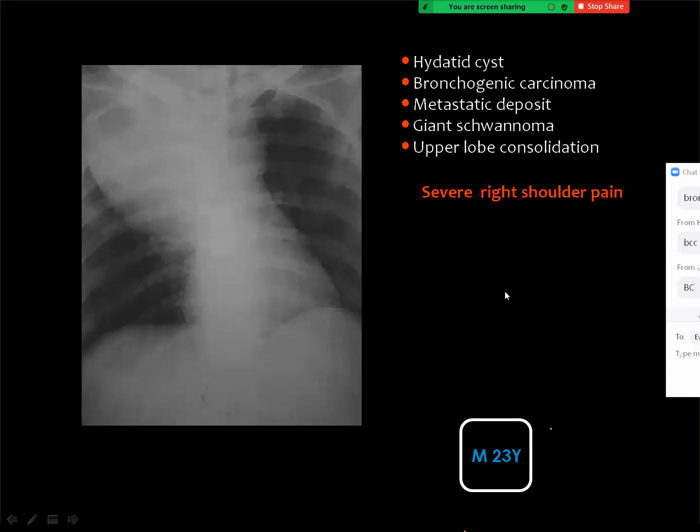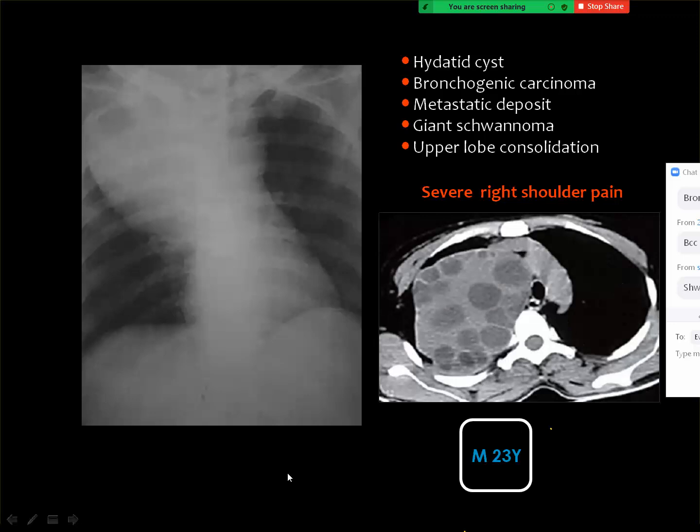Bronchogenic carcinoma, you should look carefully for the ribs, and this is very important. If you see some of the rib erosions or destructions, you may think so. And according to the rules I have given in the lectures, if you see a mass in an adult, you think of a bronchogenic carcinoma until proved otherwise. And this needs the verification by CT.